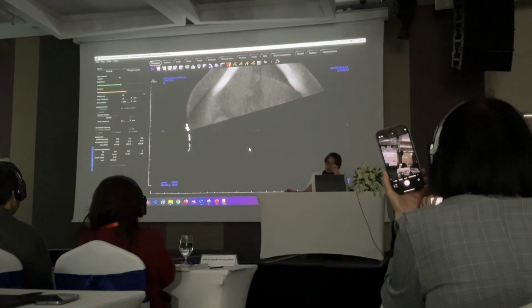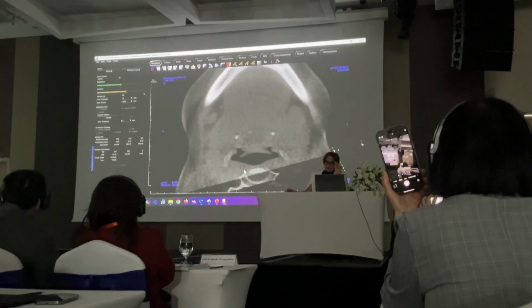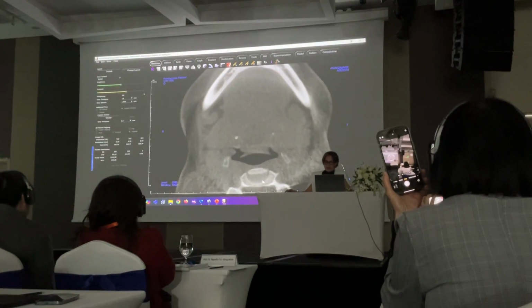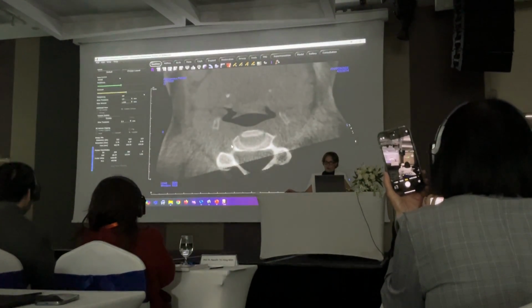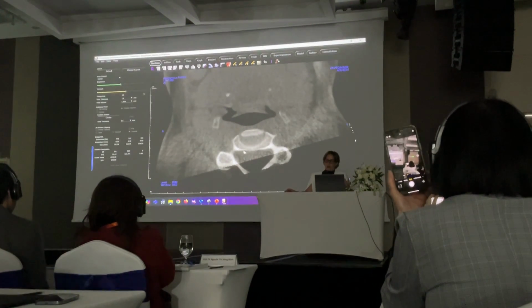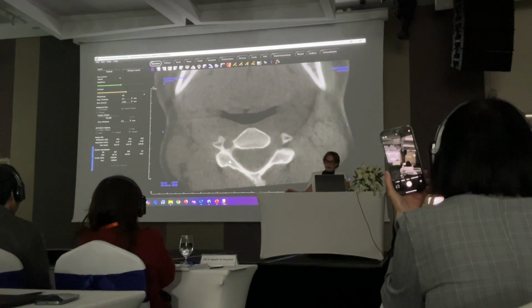And after we go through the cervical spine and skull base, we'll take a break and we'll come back and do maxilla and mandible, okay? So bone has cortical outlines and medullary spaces. Here's the hyoid. These are the cervical vertebra, okay? Once again, there's a lot of anatomy, but you look for cortical continuity and medullary spaces that are uniform.